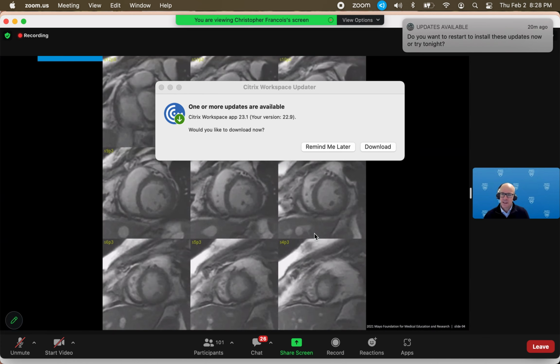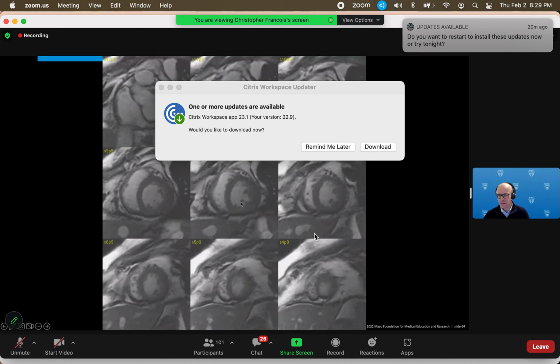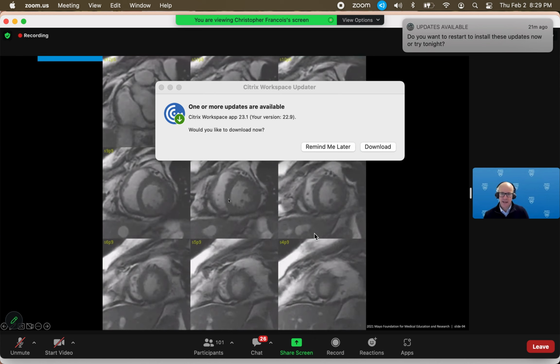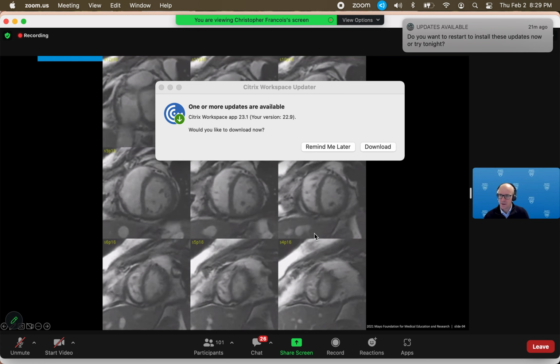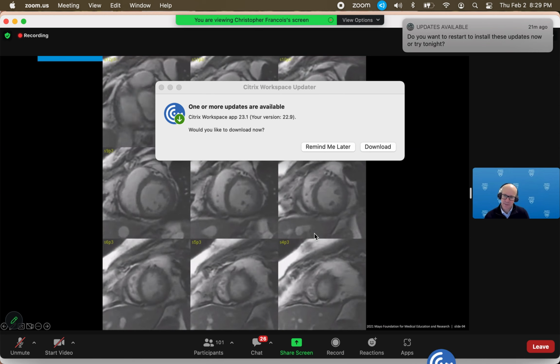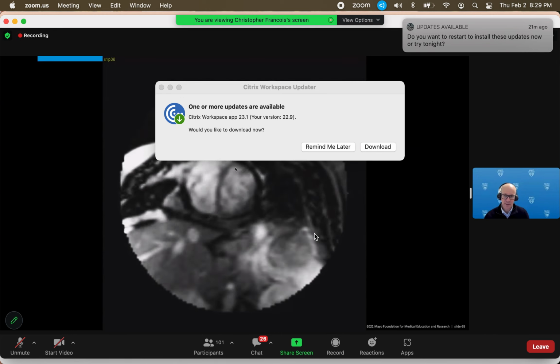This is a 40-year-old patient, again, with heart failure. They saw a septal bounce on echocardiography. The pericardium looked a little thick, so they recommend getting a cardiac MRI to look for constrictive physiology. On the cine images here in the middle row in particular, you can see the flickering of the septum. The pericardium is very thick and relatively hypointense. And so that would indicate that it's too thick. Anything over 3 or 4 millimeters is going to be too thick.